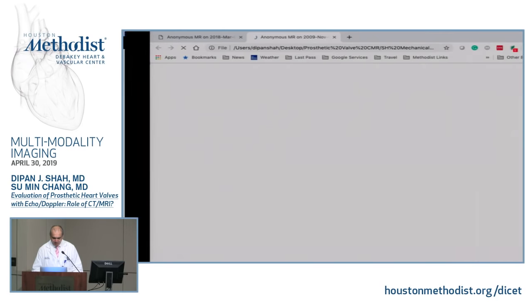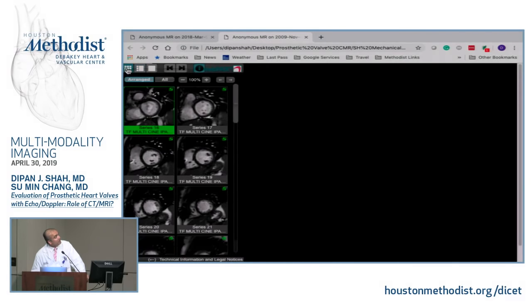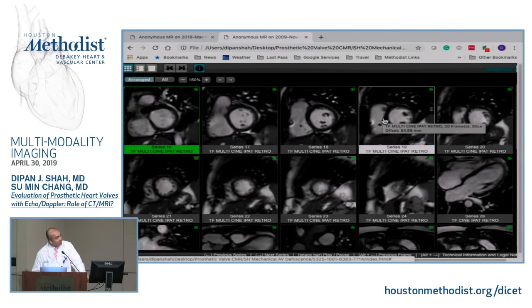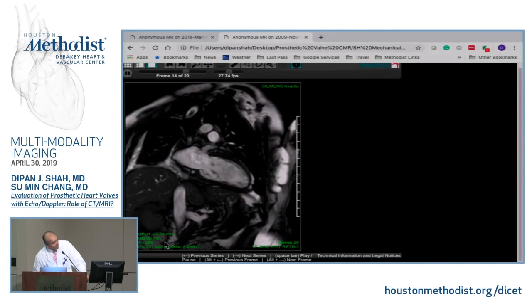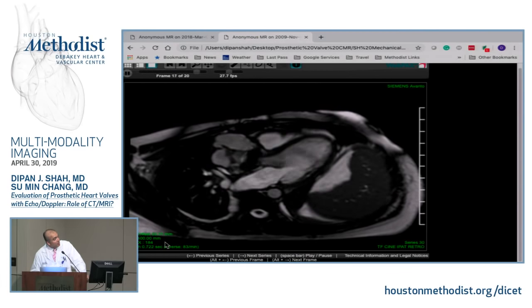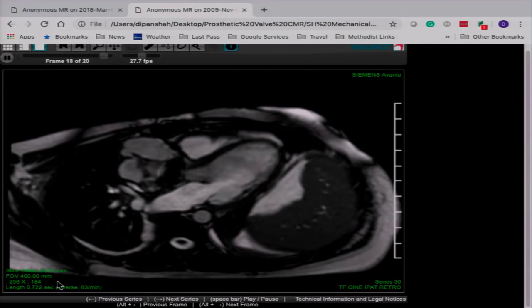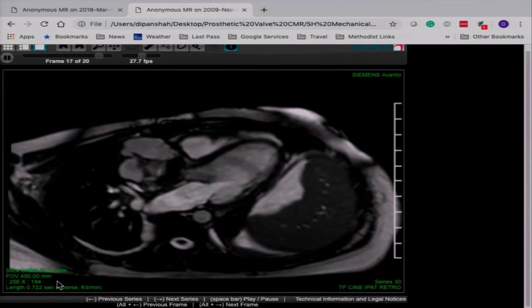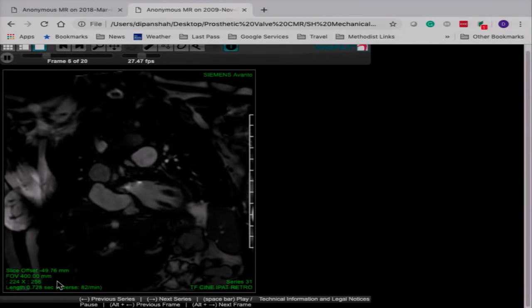Another scenario in endocarditis where I think CMR could be helpful as well is this example that's shown here. Let's scroll down again to the long axis views. I think things will become much more apparent as we get to the 3-chamber view. You can see there's a prosthetic valve in the aortic position. What do you notice here? Do you see an attachment between the valve and the intervalvular fibrosa area, the aortic annulus? There is none. And you can see this valve actually has a little bit of a rocking motion to it as well. So this is partial dehiscence of the aortic prosthesis.